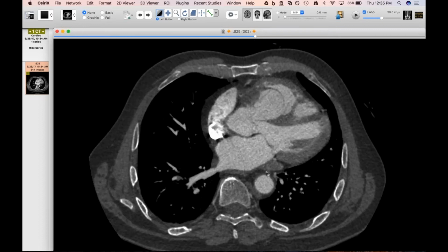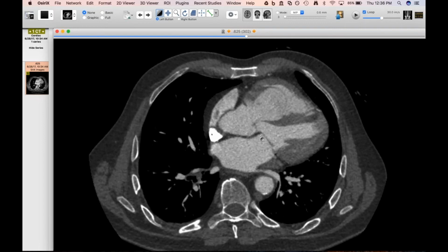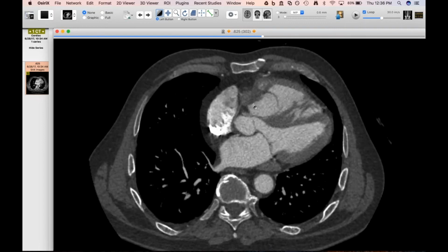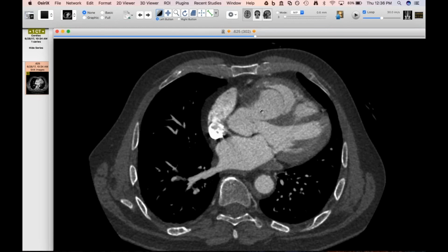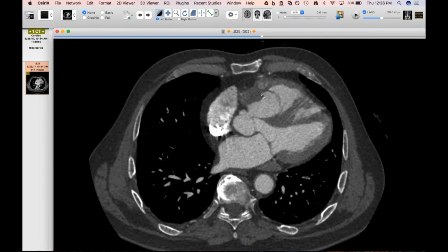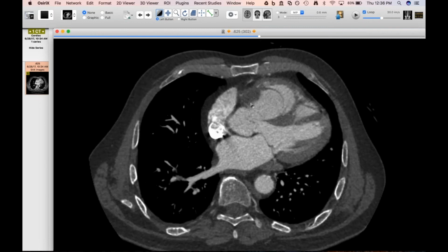Hey, Travis. Yeah. That's amazing. What is that thickening there anteriorly? Is that some thrombus? I think so. Yeah, and when you guys were talking about the dissection earlier, I was thinking about this too. There's accumulation of stuff in here. I don't know if it's just being indented by the RV wall. I think you're probably right. I bet there is some thrombus in it.